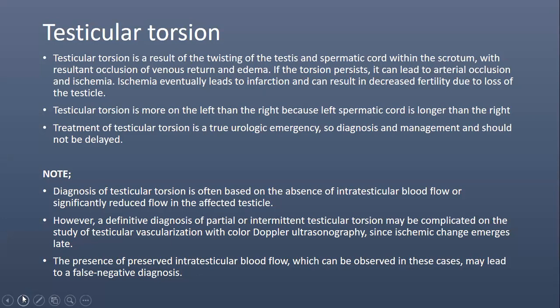In my case, which inspired this, someone diagnosed that this was an infection, but when we went there, I did the scan. It was just a repeat scan, because when they diagnosed that the patient had testicular torsion, they referred the patient to another facility where I work. I happen to work with the professor of urology, and this professor of urology told me we need to repeat this scan because what I'm getting clinically doesn't correspond with what the sonography of this other person did.